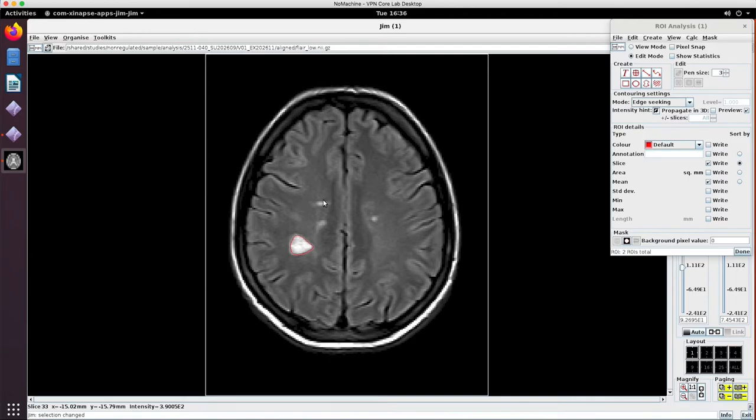And it's important to remember that we're working three-dimensionally. So you're looking at two-dimensional slices of a three-dimensional object. As we move through, it's important to think about connectivity and continuity. And as we quantify the images, these ROIs will be stacked and put together as the slices are, and analyzed as three-dimensional objects.